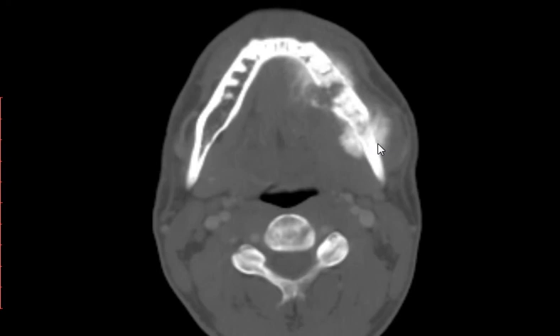What's your diagnosis? Not differential, diagnosis. This is a spot diagnosis. This is osteosarcoma of the bone. He's 20 years old; Ewing is much younger. This is osteosarcoma of the mandible. It's a rare location for osteosarcoma, however, it happens. Of course, biopsy proven osteosarcoma.